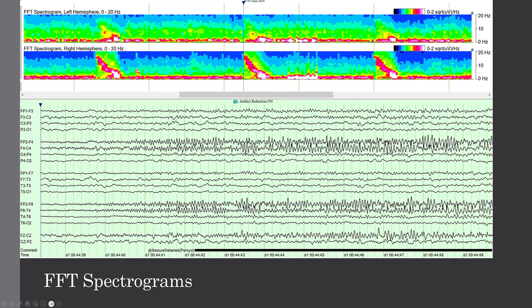So this is using an RGB, or red, green, blue, color scale. This is the one that's used more commonly in Persyst. And again, this is more about tradition and the way things have been rendered over time. There's not a right or wrong. There are different color palettes that may be more suitable. If somebody has color blindness, for instance, you may not want to use this sort of trend panel. You may want to use one with a different color scale. So all that's adjustable. There's that same pattern. They've been traditionally referred to as flames. There's that decreasing frequency as a seizure evolves.